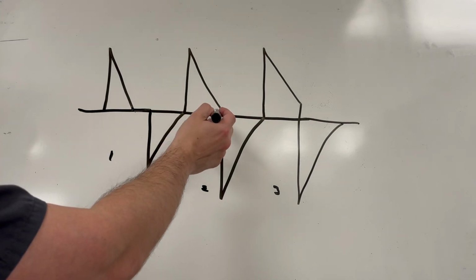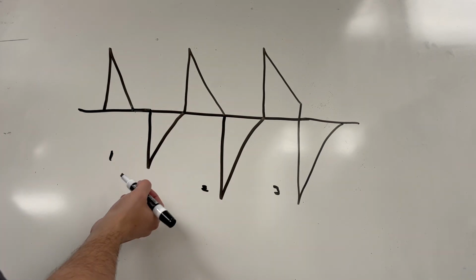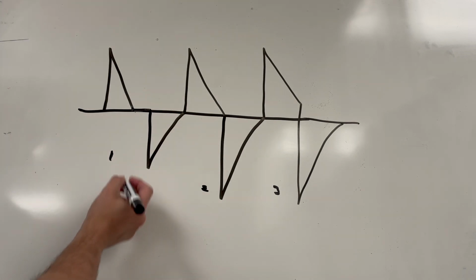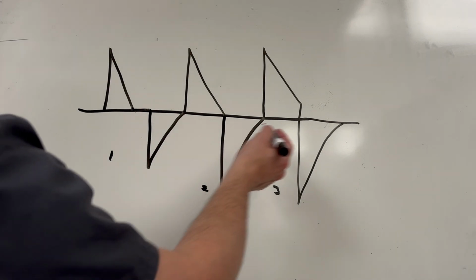And here, this is how we want it to actually look, where we hit zero flow and go straight into exhalation. So if we go from this shot to this shot, our compliance has actually gotten better.